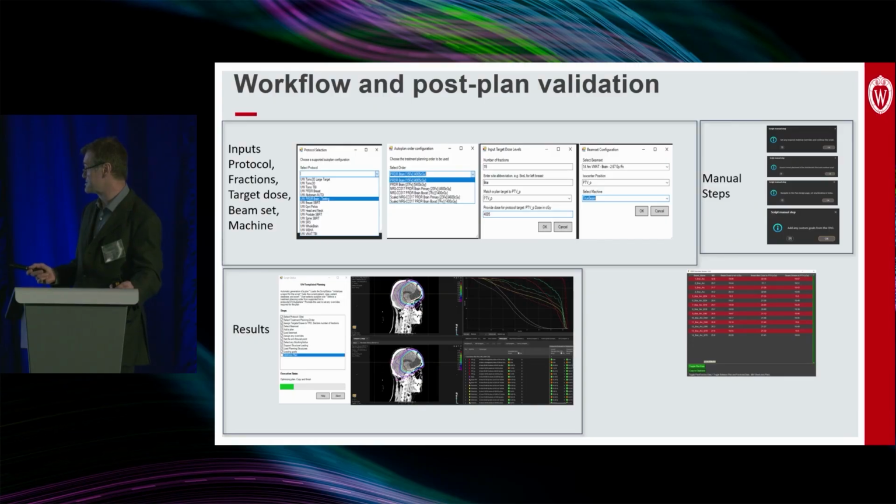And so these are just templates that are loaded. There's a few different manual steps here. I apologize, you won't be able to read them, but essentially they have to go in and do some things that I don't know how to script, like block the eyes and, well, the couch is inserted, but make sure that the couch is placed in the appropriate place, and put in some fiducials. And once that's done, then they just hit play, and they come back in between 5 and 30 minutes. And they have a fully optimized plan.